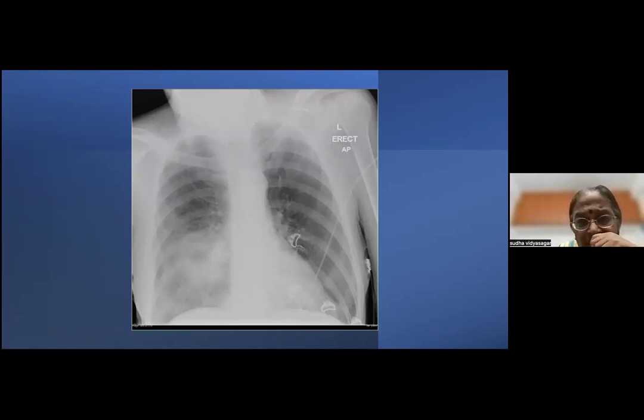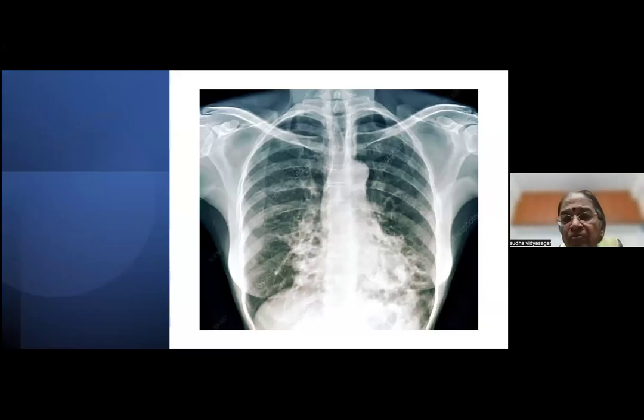Okay, look at that. What does that show? Okay, we'll go through with this. This is definitely a consolidation here. Okay, and there is an attempted cavitation here. The diaphragm is seen, the heart is seen. They're not touching either of them. So it could be again one of the apical segment of the lower lobe, one of those segments with a consolidation, with a cavitation probably inside. Okay, so we'll just say cavitatory pneumonia as probably the best possibility. What does this show?